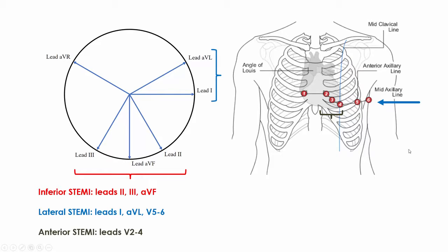Now, when you're looking for ST segment elevation, you also eventually end up looking for reciprocal ST segment depression. Now, in a patient who's got inferior ST segment elevation, the reciprocal depression, well, there are no superior leads, so where do you see the reciprocal depression?